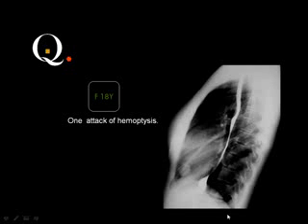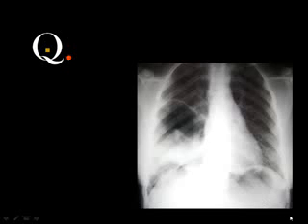Nodule, yes. Which one of the 6 nodules I have mentioned? Yes, very good. This is an AVM malformation because you see the nodule is connected to the hilum by a vascular pedicle. And I have said that the vascular pedicle may be single or multiple or double, because in cases of a single vascular pedicle, the other one is hidden behind the first one.